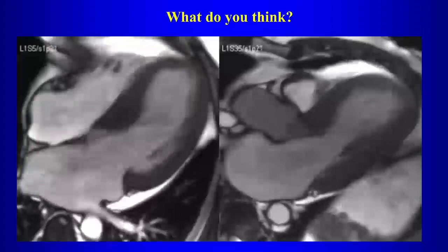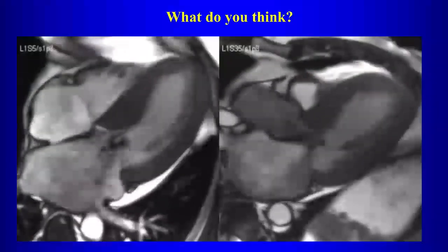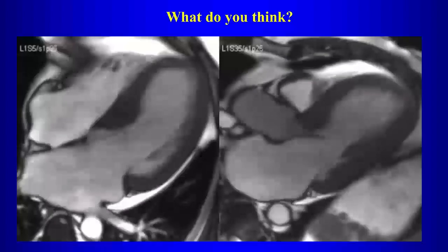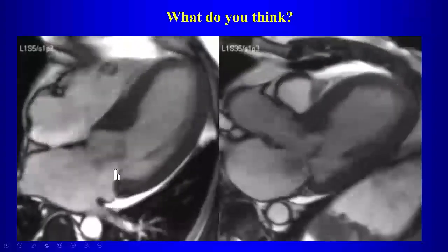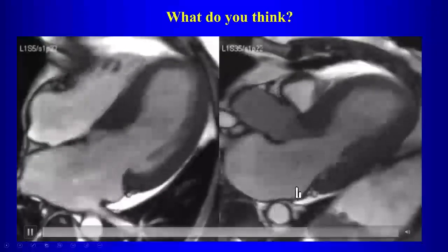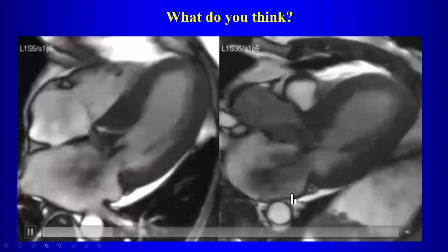Anything to say? What do you got? Can you guys do better? There is mitral regurg. Yes, there is mitral regurg. Is there any other problem?